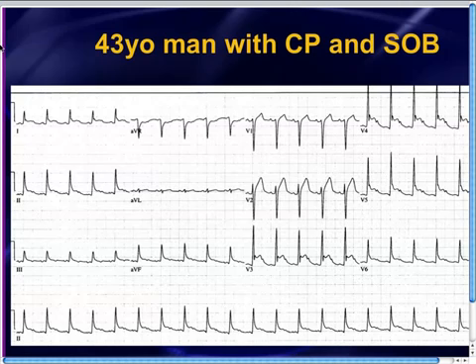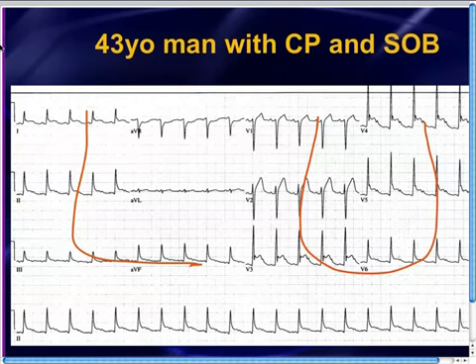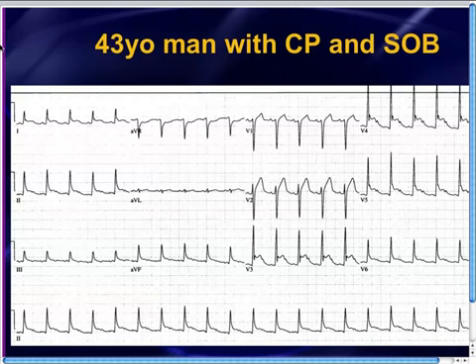But I did want to address those extra blips in there since we've been talking about extra blips over the past couple of weeks. The main reason to present this case is to focus on ST segment elevation. And you'll notice that there's a whole heck of a lot of ST segment elevation. There's ST elevation in the limb leads. There's ST segment elevation in the precordial leads as well. So a lot of ST segment elevation.